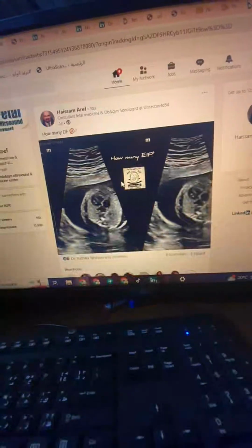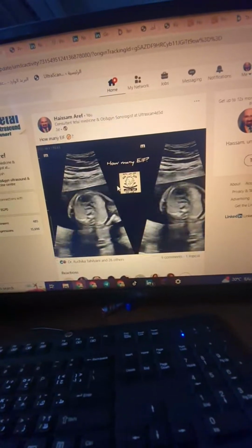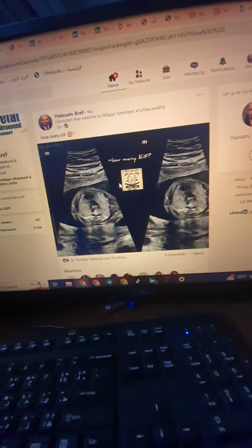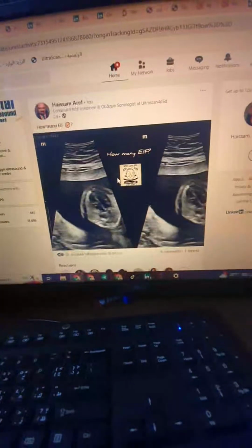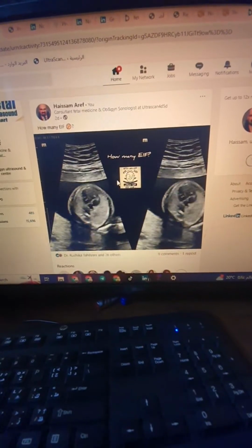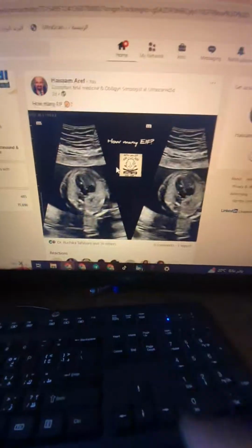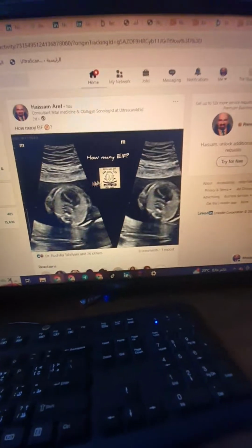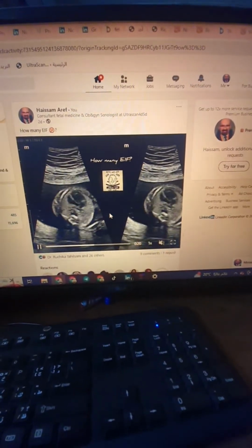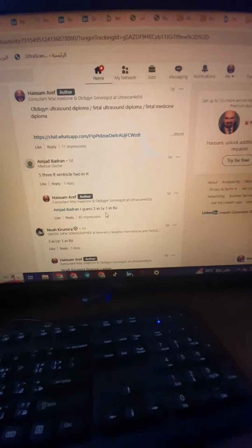I've been meaning to get a case of echogenic intracardiac focus, but I always say I will not put a case with only an echogenic intracardiac focus. It's insignificant. Then I encountered this case showing three echogenic intracardiac foci in the left ventricle and one in the right ventricle. We do have four echogenic intracardiac foci. So I did mean to put a case of numerous echogenic intracardiac foci like this case.